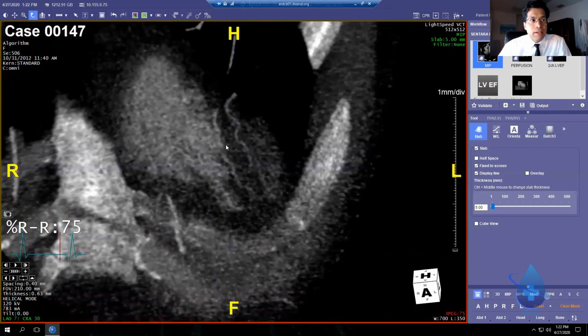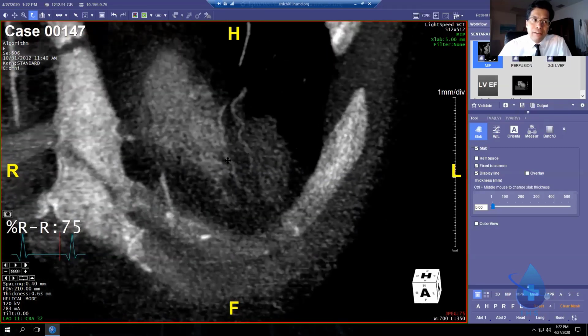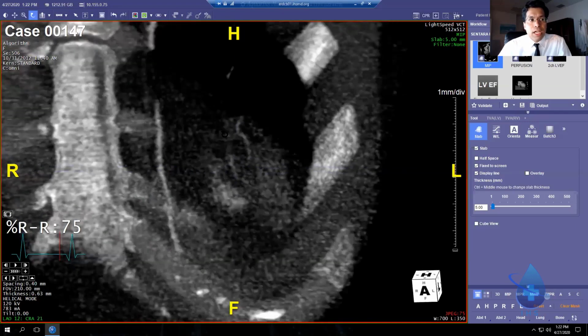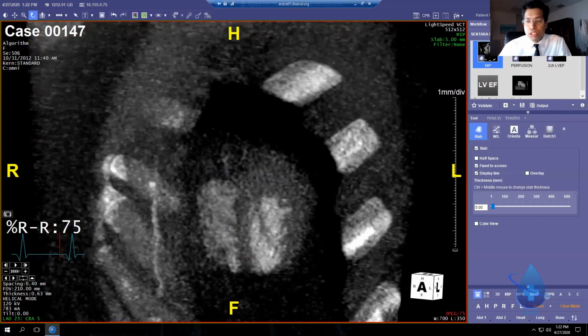Okay, now down here, this is looking kind of piddly. Why does this look piddly? Well, you've got to remember that there is no engaged catheter here, okay? You guys know what kind of streaming you get in the cath lab on a weekday when you don't push on the manifold, when your bicep is feeling kind of piddly. Well, the same thing happens. Think about the amount of streaming you get in the cath lab if you don't push on that manifold. Think about the kind of streaming we're getting here when there's no engaged catheter at all in the patient.